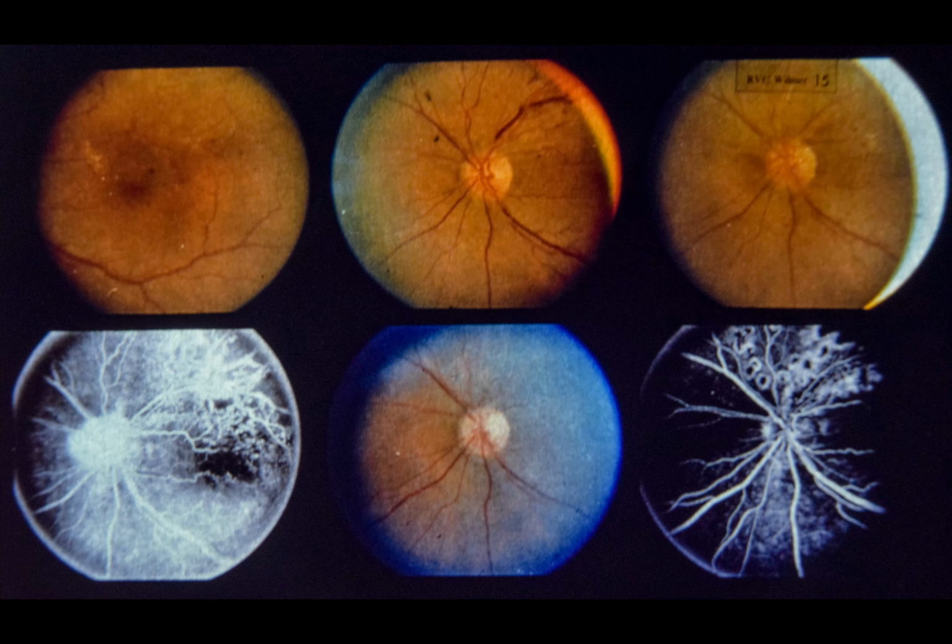Slide 15. Natural history and photocoagulation treatment of branch retinal vein occlusion. This patient was illustrated in slides 13 and 14. Upper left, in macular photographs from September 1973, approximately 2 years after acute venous occlusion, note marked clearing of retinal hemorrhage, but additional lipid deposition in macula.